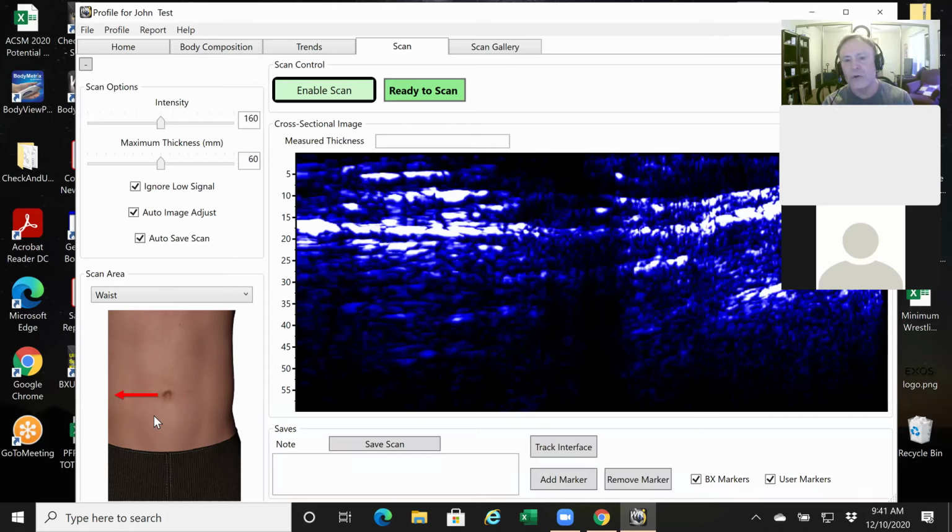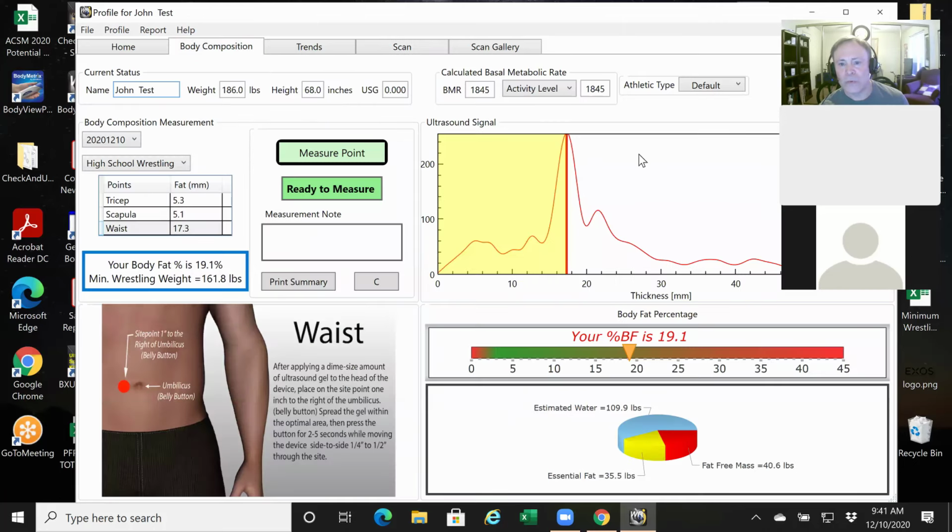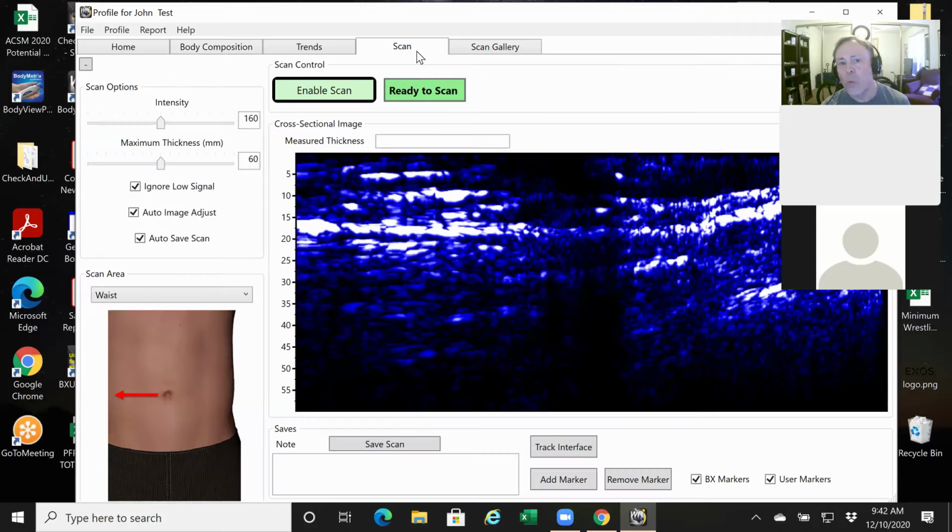So how do we interpret this? How can we cross-reference that measurement? Well, believe it or not, the thought process is virtually the same as our thought process with this 1D measurement, okay? We know that when we're looking for kids that have excess fat, we're looking for a strong signal beyond 10. The white signals in the image, guys, they're exactly the same thing as those peaks that we saw in the 1D measurement we just went over.